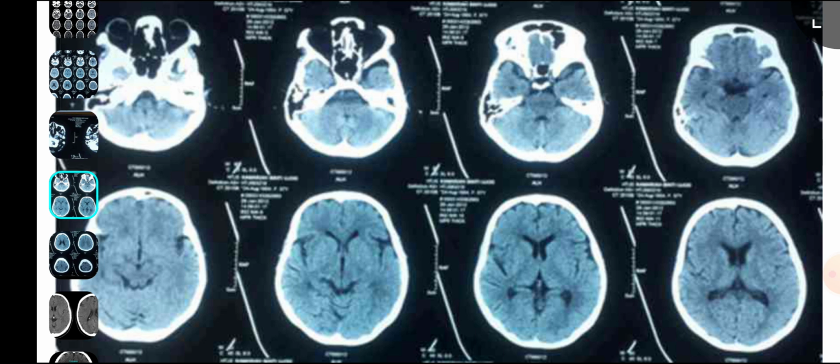Okay, you know, the cerebellum and the occipital. So this is cerebellum, this is cerebellum, this is cerebellum now. When it starts completing this half of the picture, here's a little occipital. This is occipital lobe. This is how you differentiate between them. This is just a trick.